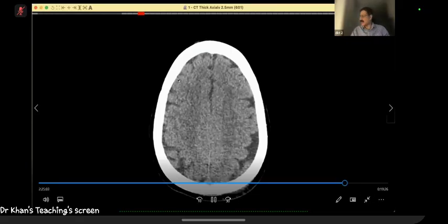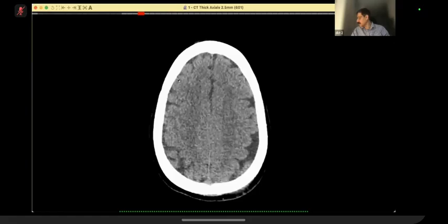There were no very significant injuries on examination, but there was an occipital hematoma. And she had pains and aches everywhere. We did a CT of the whole body. The rest of the body was fine. But of course, the brain part they were particularly worried about because there was an occipital hematoma, clinically speaking. So over to you.